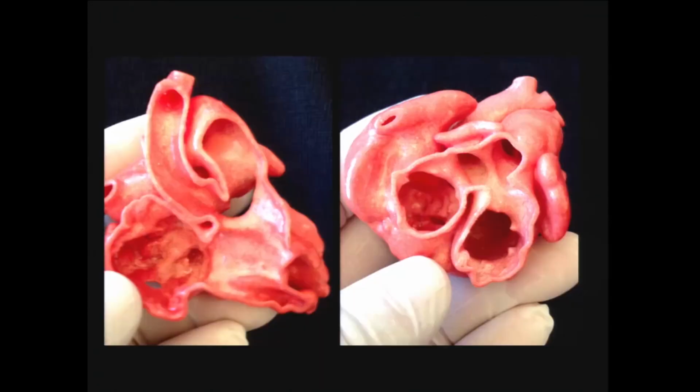Okay. So here you have the ventricular septal defect, certainly in the outlet, and below the aortic and the pulmonary valve. Okay, so doubly committed. However, this patient certainly has an infundibular septum here. So in the basal view, this is the left ventricle, right ventricle, VSD, doubly committed, and the infundibular septum is there. So for doubly committed VSD, there are cases actually having an infundibular septum on the top of the VSD.